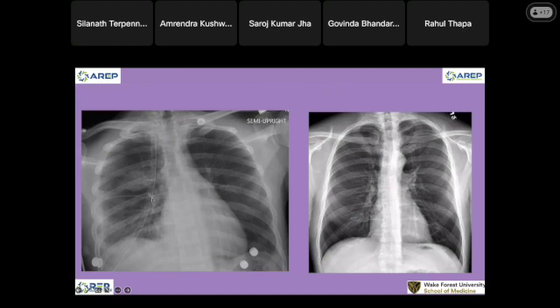We have chest tube placement. Okay, just that chest tube is here, and normally this becomes bad looking on CT. Why do we put a chest tube in there? You have to ask me back. This is a left upper lobe adenocarcinoma. Okay, what is the purpose of this chest tube?